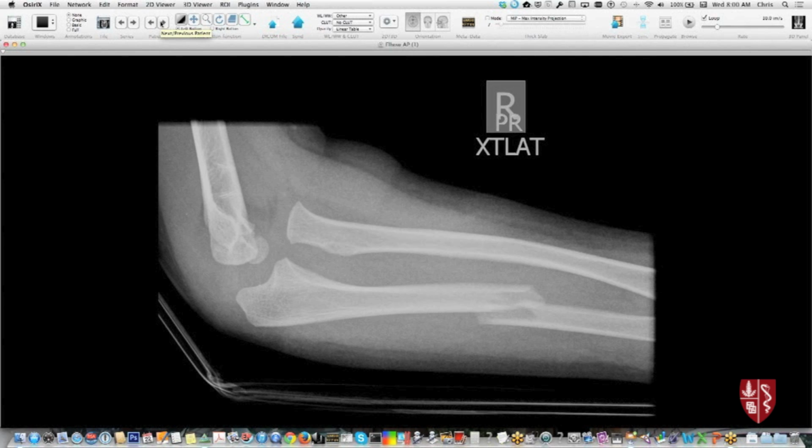Okay, different example here. There's a couple problems with this patient. Again, a young patient. Obviously, there's a fracture involving the mid-ulna here. And then remember, even in kids, you should be able to tell that there's normal alignment of the radiocapitellar joint. Here's the radius, and it's shooting up towards the humerus. Here's the capitellum in here, and it's dislocated, right? So this is like an eponymous abnormality that I'm sure you're all saying to yourselves right now, the Italians.